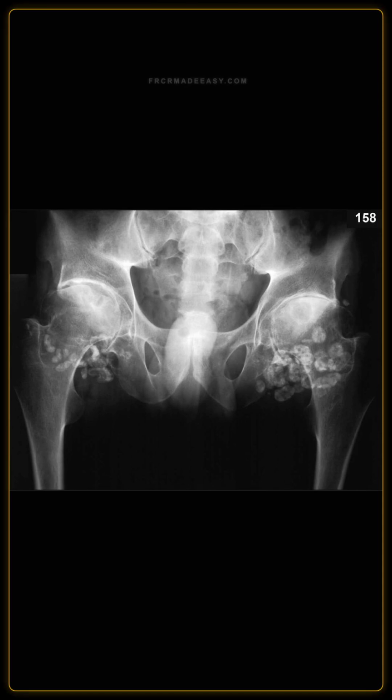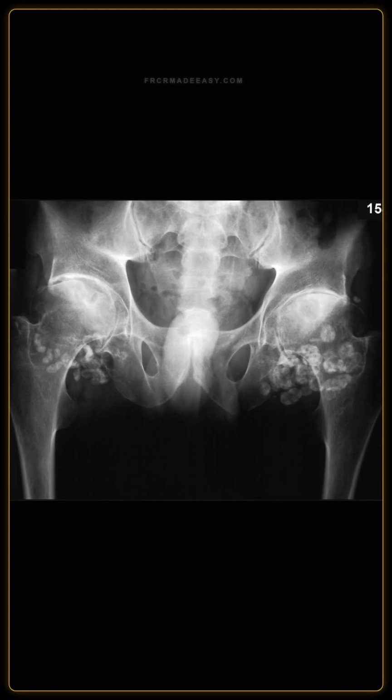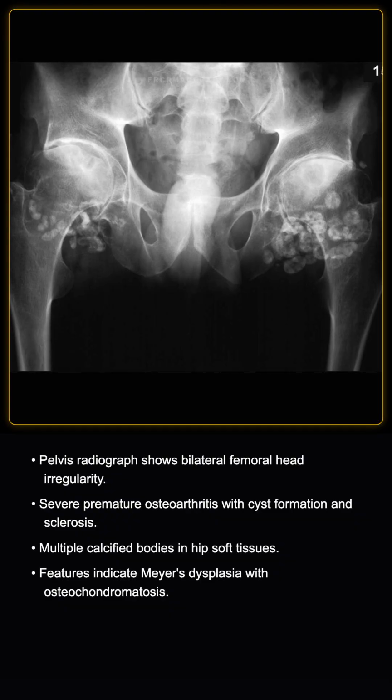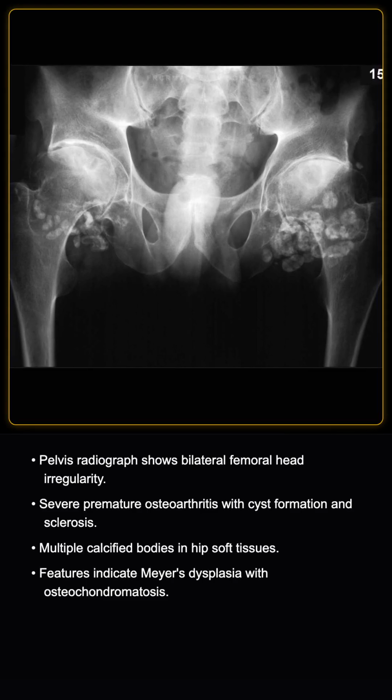A 28-year-old male presents with bilateral hip pain and stiffness. I am showing you the pelvic radiograph. Describe the findings. Let me just study this for a second. Right. The pelvic radiograph demonstrates severe bilateral irregularity, fragmentation, and flattening of the femoral heads.